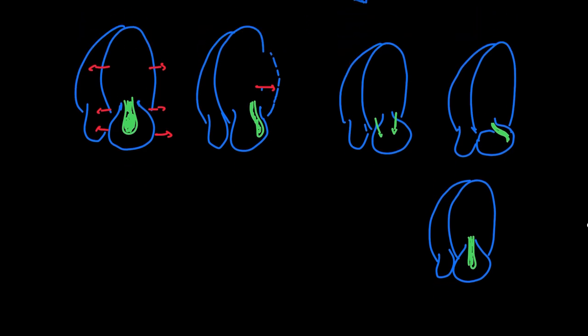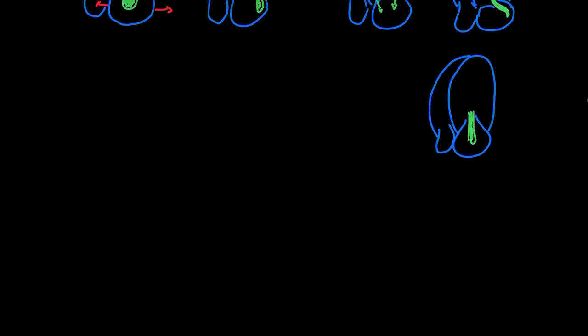So depending on the mechanism, whether we're talking about a problem with the frame, meaning the ventricle, the annulus, or the atrium, and those are all dilating, or the ventricular wall has a wall motion abnormality, that can lead to mitral regurgitation, or if you have a problem with the leaflets themselves, a perforation, a prolapse or flail, or just degenerative leaflets, those will lead to mitral regurgitation with very specific patterns. So just looking at the color pictures, you can often get a good sense of what is causing the leak. Now let's move on and talk about how we would quantify the leak.